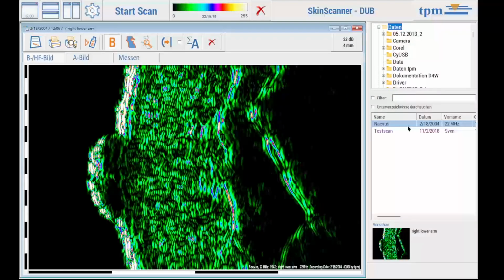To open an image you have two possibilities. You can go with a double left click on the respective name when the large picture opens, or below with a simple left mouse click on the thumbnail.